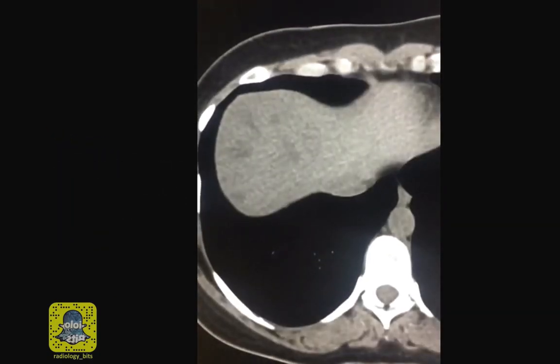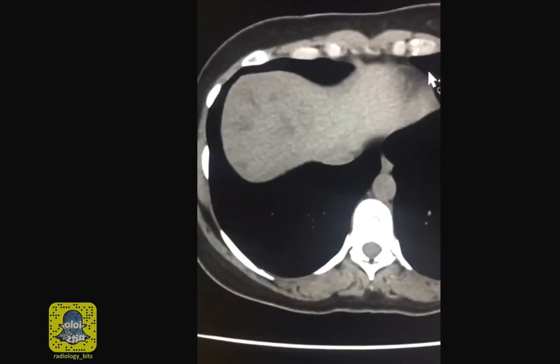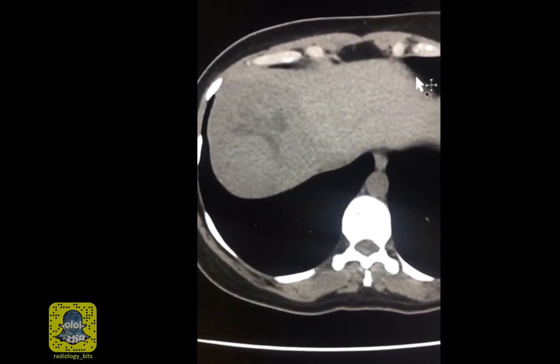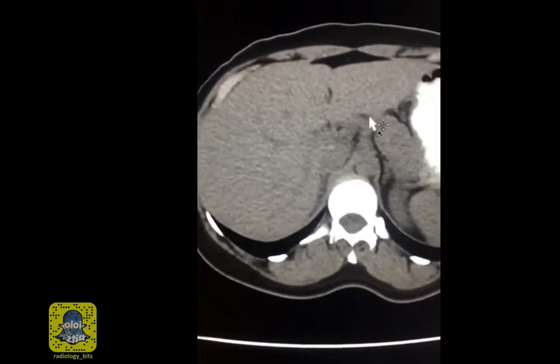Welcome again, everybody. This is a liver case on a 47-year-old female patient. This case is dedicated for juniors, since lots of students and junior radiology residents asked about this in relation to our previous case. So for juniors, there you go. Let's concentrate on the liver.